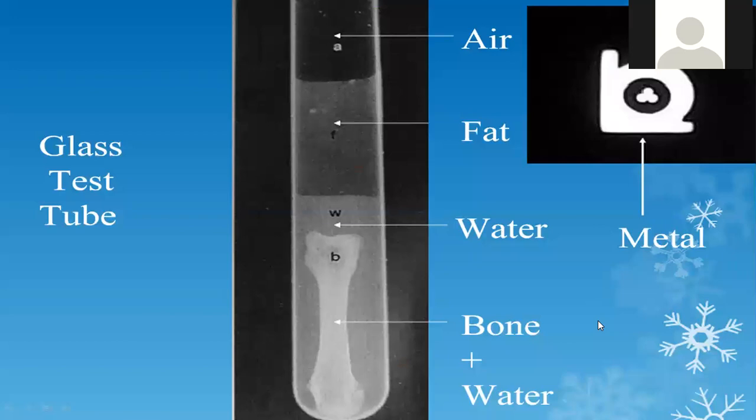We will start with this piece of test tube. This is a very nice demonstration of what we can see on the plain X-ray. All of this test tube can explain the differential density on the plain X-ray. This is the air density, this is the fat, this is the water, and this is the bone and water. From that point of view, we can imagine what we are looking at on the plain X-ray. The same applies to the MRI, but in different situations.